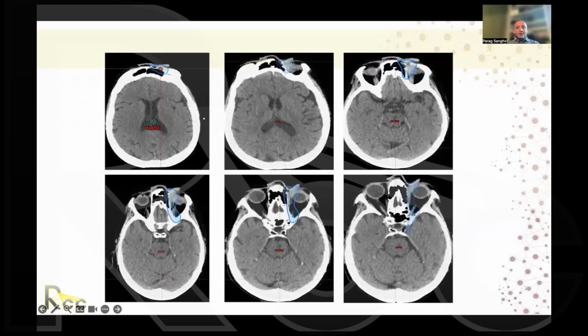This is again one of my patients. You can see the patient actually has radiographic PNI. You can see all this thickening is actually gross disease, and so you can see I've contoured in the fissure, contoured in the tumor, contoured a nice CTV coming along here. So you can see this is my CTV, and then you can see the CTV is now extending inside the orbit. I'm swinging out here to the superior orbital fissure, and from the superior orbital fissure, then I'm swinging out to cover the cavernous sinus.